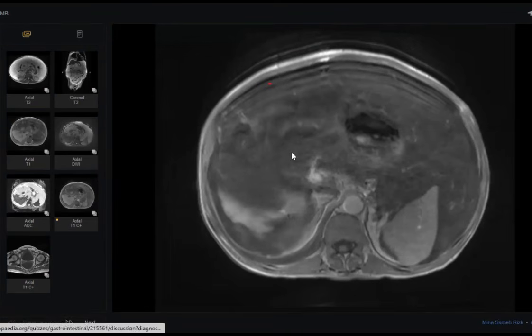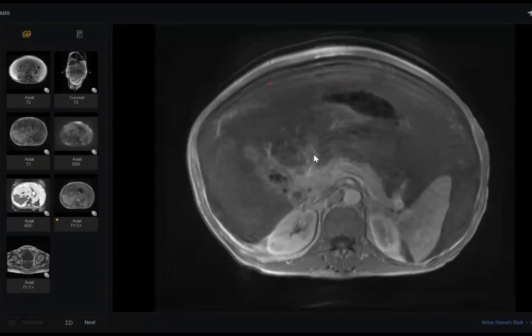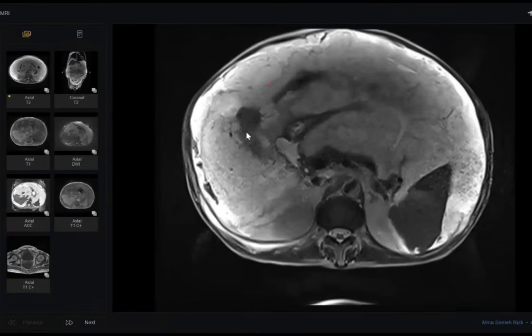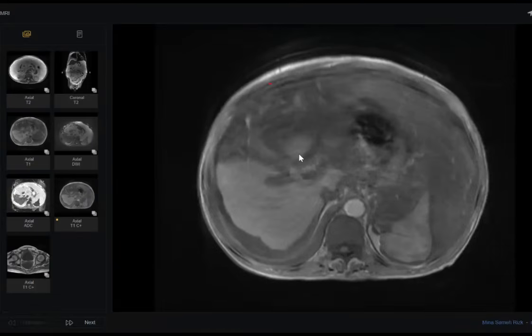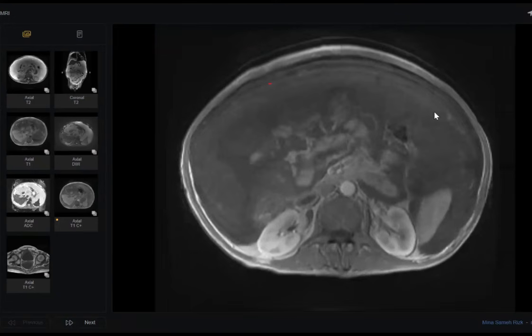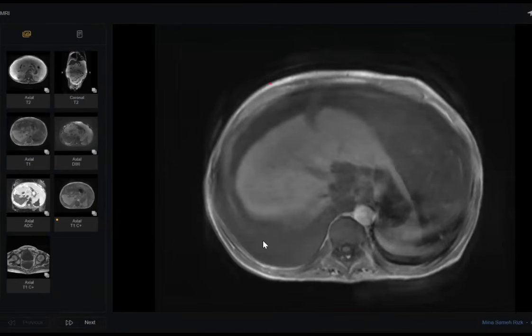It is not mentioned in this case, but the most important thing is that you mention all the possibilities and that you pick up that this is pseudomyxoma peritonei on MRI. Why? Because on T2 it looks like soft tissue, and can be confused with soft tissue, peritoneal deposits or mesothelioma. But the key here is the post-contrast: almost no contrast uptake. So it is very important to be aware of pseudomyxoma peritonei on MRI.